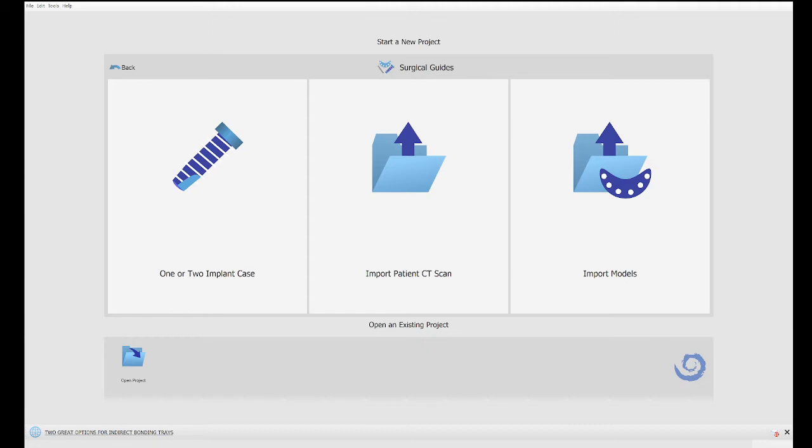If you see here, what you need to make sure of, if you're taking your CT scan at the office, is that the files are going to be in DCM or DICOM. If somebody's giving you a CD, make sure they give you the files in the right format.